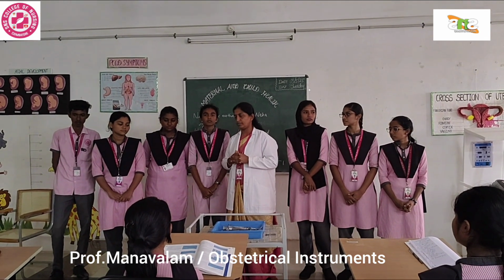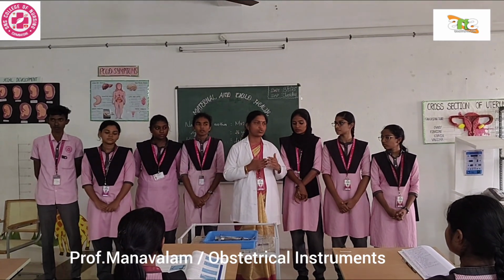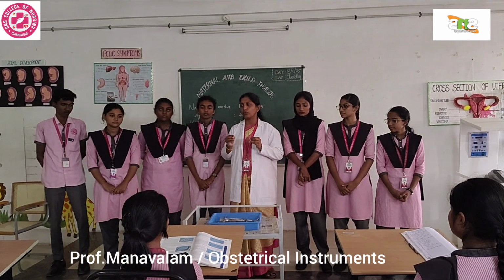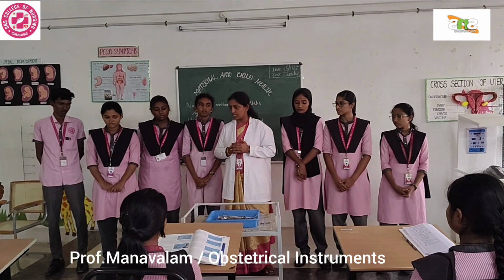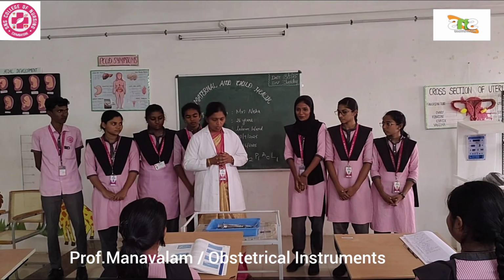For this purpose we are using the obstetrical forceps. Today we are going to see some of the instruments commonly used in obstetrics. First I will call Ramzana to explain one instrument.